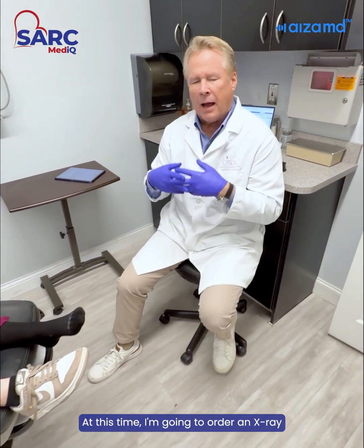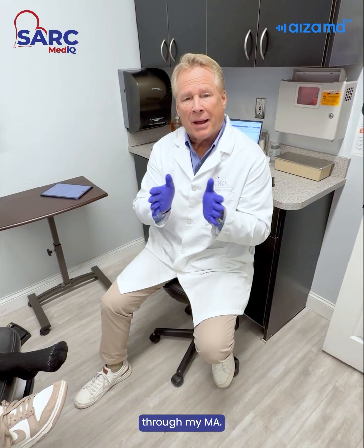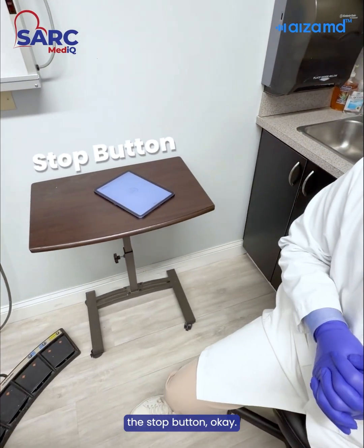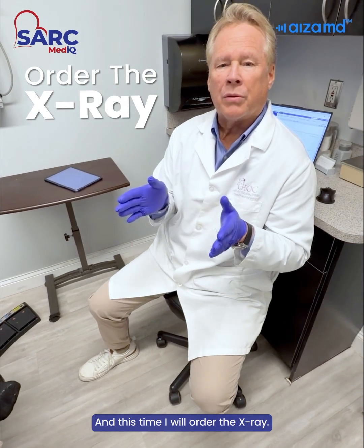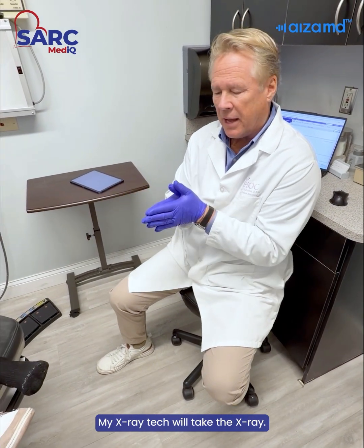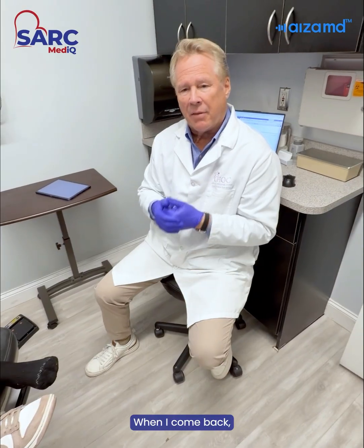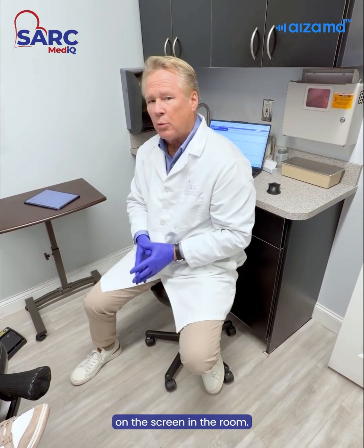At this time, I'm going to order an x-ray through my MA. At that point, I can hit the stop button, okay? And at this time I will order the x-ray. My x-ray tech will take the x-ray, and I will walk to another room and see another patient. When I come back, we can have the x-ray on the screen in the room.